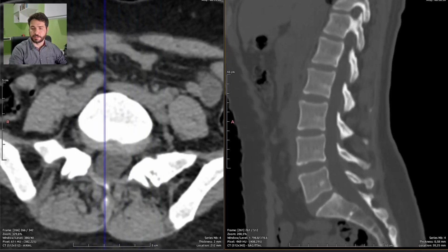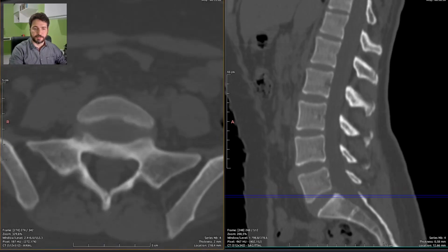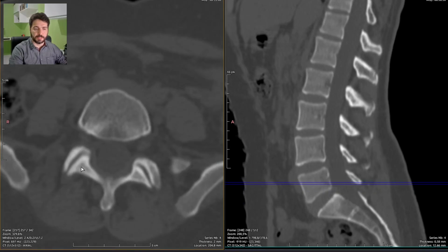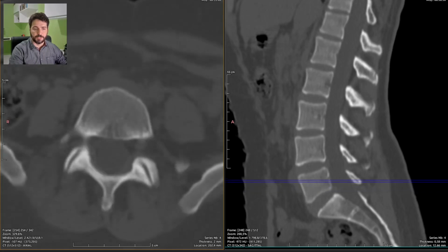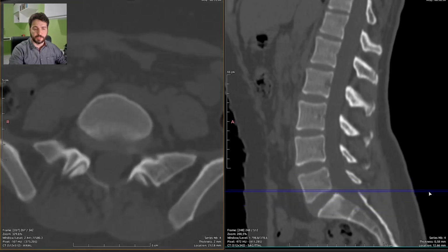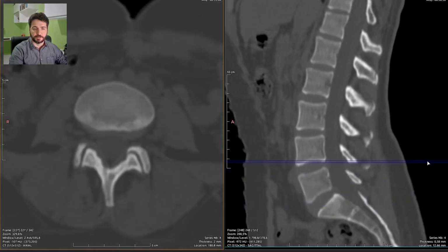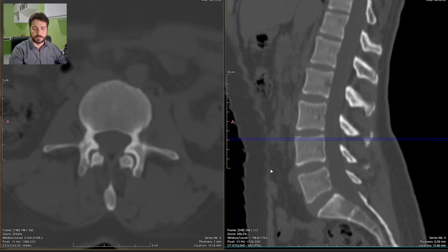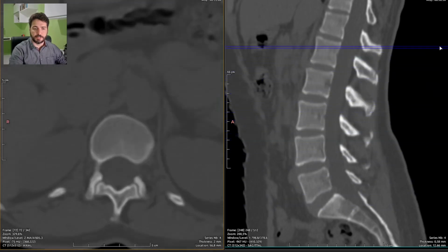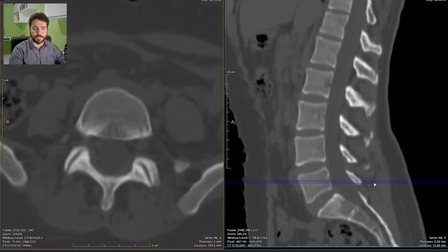This is where it's supposed to begin, the aging process of the spine. I can say there's some hypertrophy and some sclerosis, maybe a few tiny osteophytes, so there is some sort of arthrosis just beginning to show up. Yep, tiny signs of arthrosis, nothing major. Still, this could be painful.